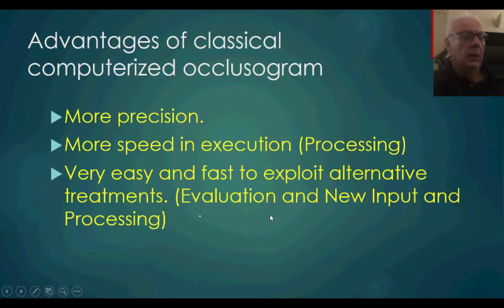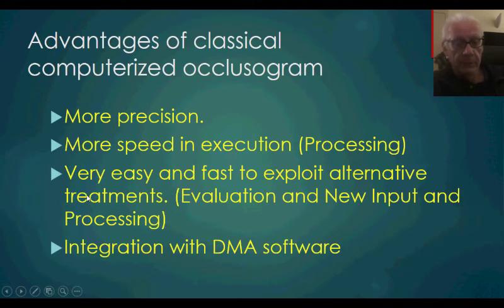So you can see, oh well, this case I think it can be done with extraction or non-extraction, or expand more, expand less, or maybe you define different symmetry axes, and the computer in a matter of seconds tells you what happens if. So this is very, very fast. Basically, it gives you the same results as we were doing with the manual procedure.